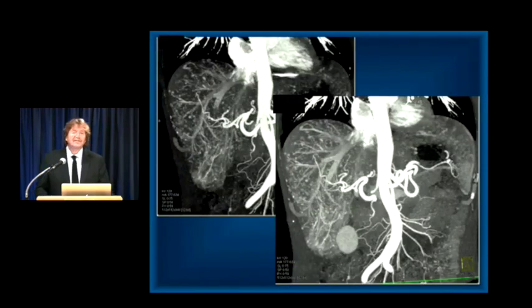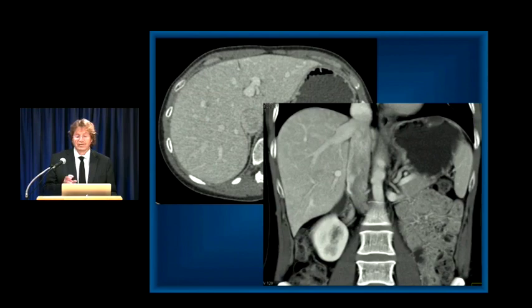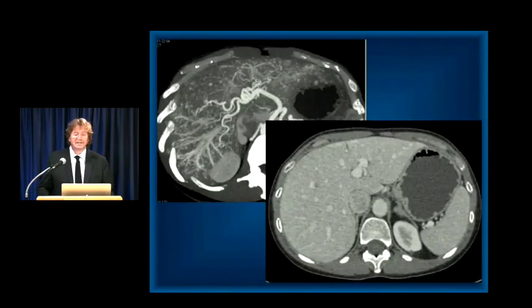Can you mistake this for something else? Well, does it look like multiple small vascular mets? But when you follow the vessels and they're intertwining, you look at the lungs, it's not going to be a difficult diagnosis. And as I mentioned, same case, venous phase imaging, everything is gone. So again, it's really an arterial phase diagnosis, and here the images are side by side.